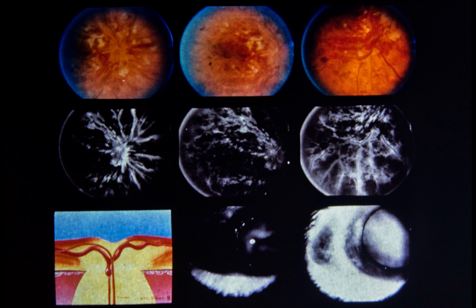Staining of vessel walls and leakage from retinal vessels is caused by hypoxic damage to vascular endothelium. Lower left, artist's sketch shows blood in anterior two-thirds of retina, especially nerve fiber layer and inner plexiform layer. Lower center, dye is visible in iris vessels 25 seconds after injection. Lower right, note dye leakage from iris vessels 10 minutes after injection.